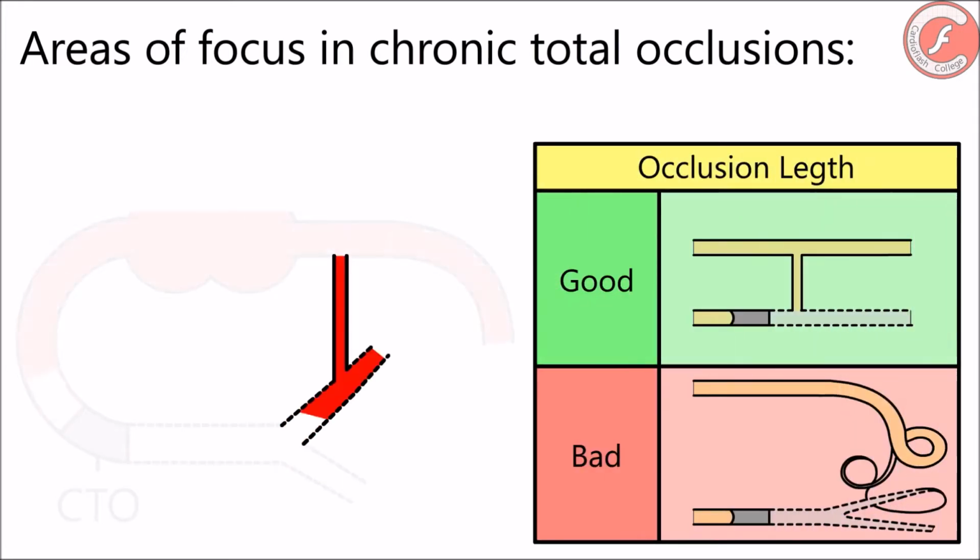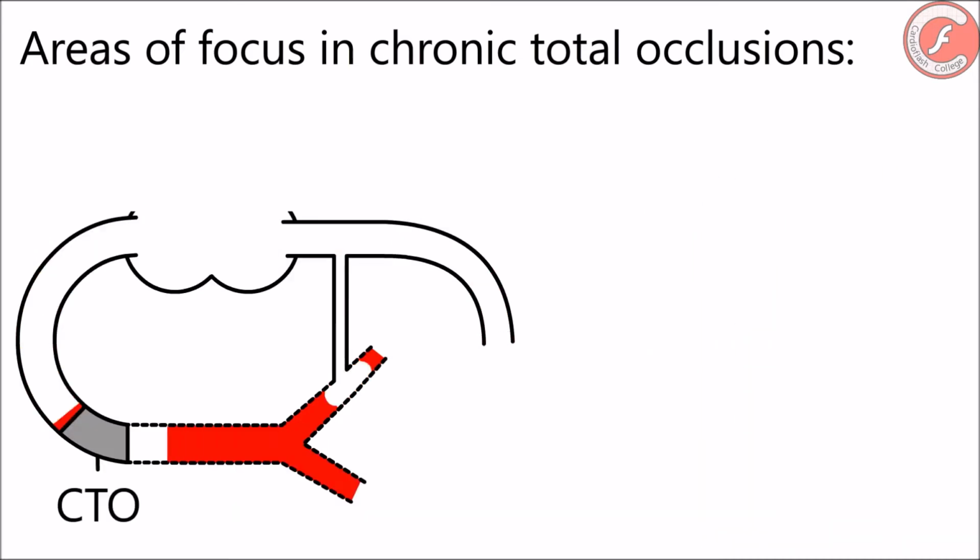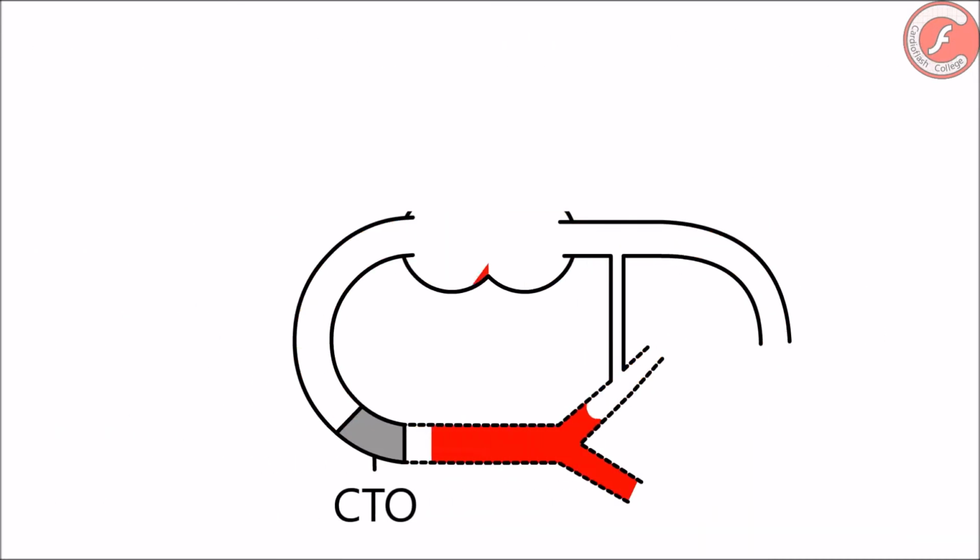Collateral circulation. As you know, there is a network of interarterial connections that supply a vascular territory whose proximal blood vessel is occluded. In this case, it is important to describe not only the origin of the network, but also the caliber of the vessels and their nature. Thereby, the development of collateral circulation does not involve myocardial viability, but eases the percutaneous coronary interventionism.